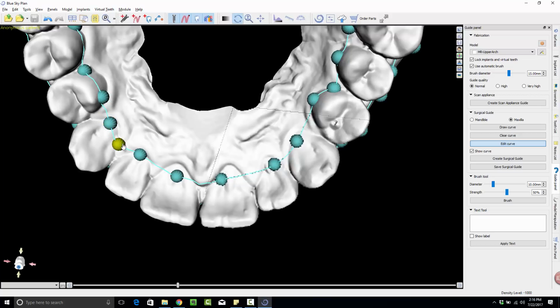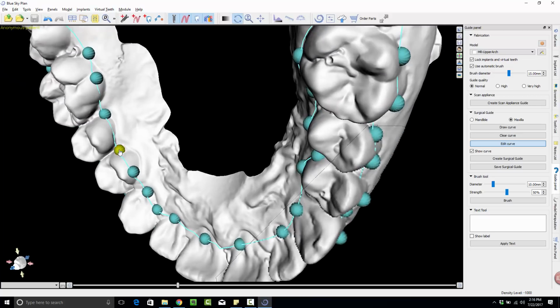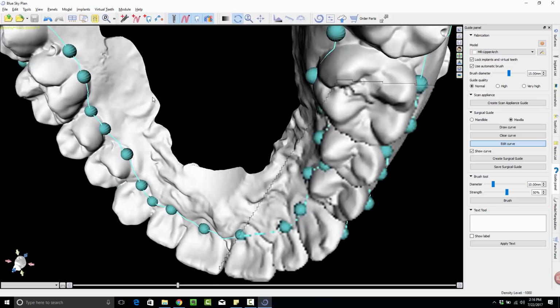Alright, I think we're probably pretty good at this point. I'll get this a little bit closer around here.